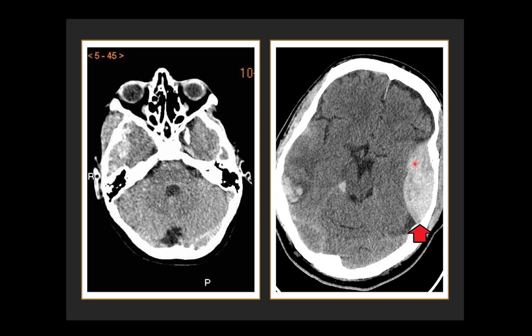So important is to identify it initially, because once it has expanded, it already has complications: compression of the brain, compression of the vessels, basal cisterns, foramen magnum effacement. So it has a bad prognosis. As soon as it is identified, the neurosurgeon should be involved. Okay, so this one is the extraaxial or epidural hematoma.